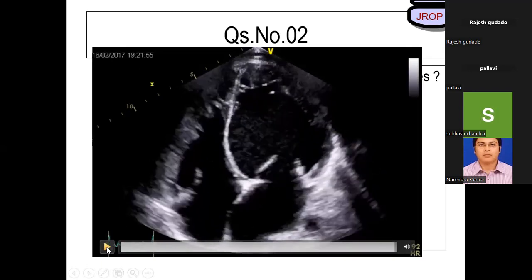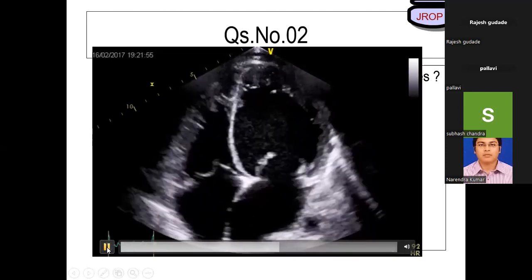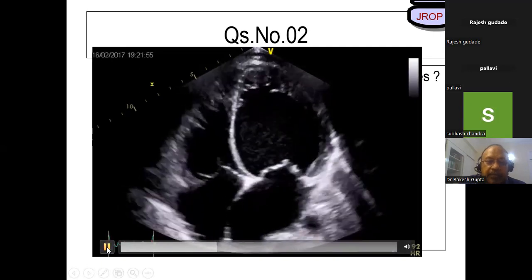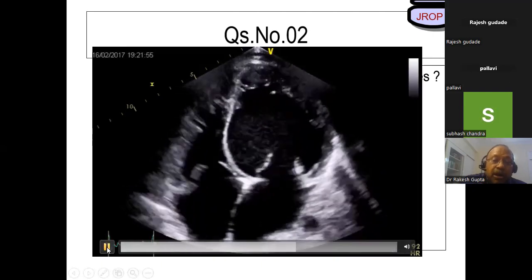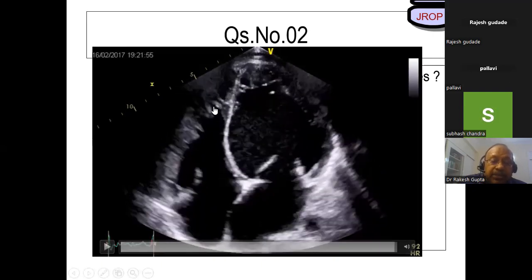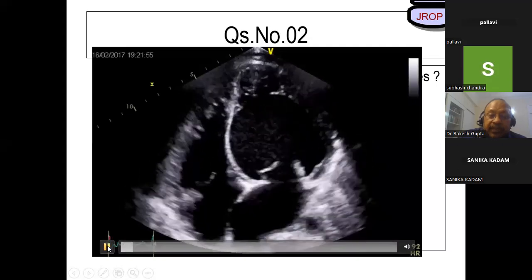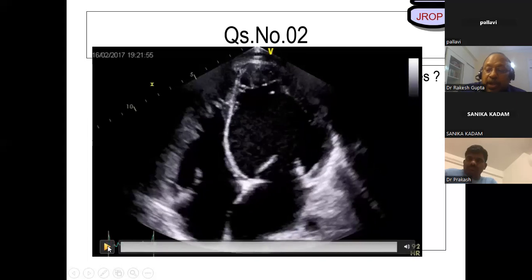Yes, sir. So it is a dilated cardiomyopathy, with the mid LV cavity dilated, and non-coaptation of LV at the apex, sir. And at the right ventricle. Correct. This is non-compaction, not coaptation, non-compaction of RV. You cannot have a better slide than this for non-compaction of RV. So when you see this kind of a picture, when LV and RV are dilated and there is evidence of bilateral non-compaction, it is a very rare phenomenon. We do not see this kind of picture very commonly.